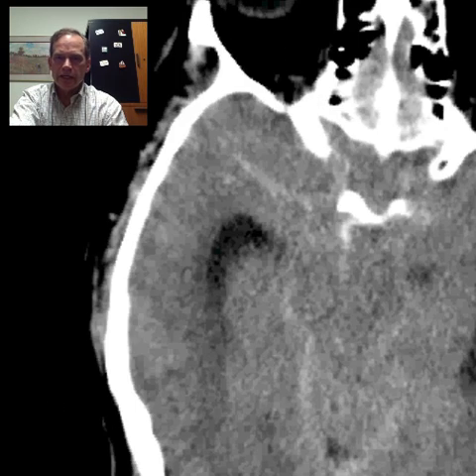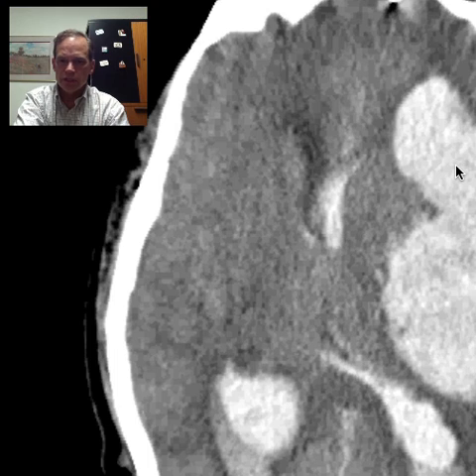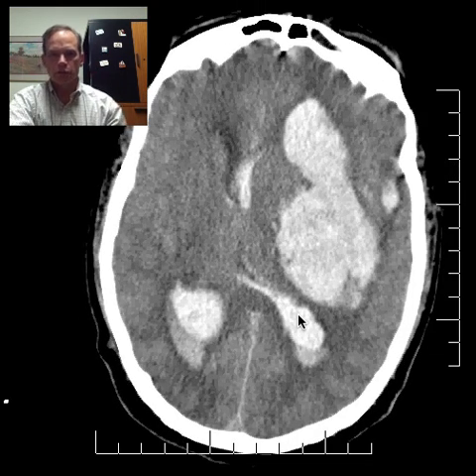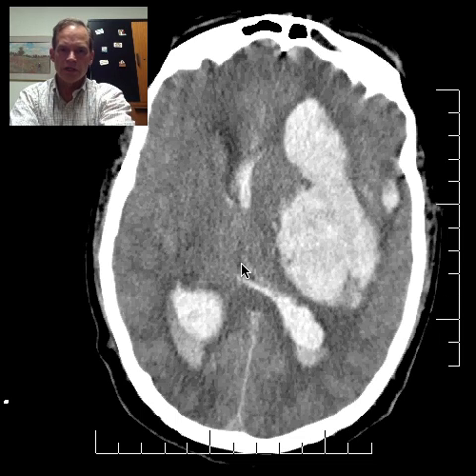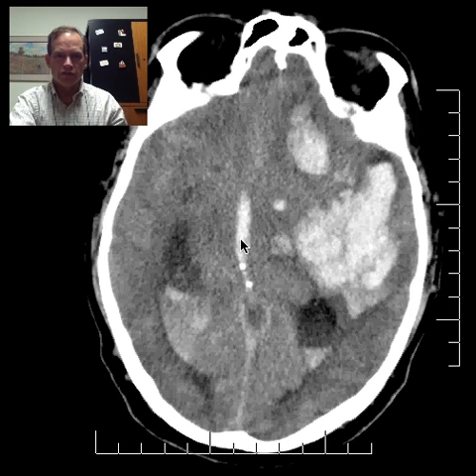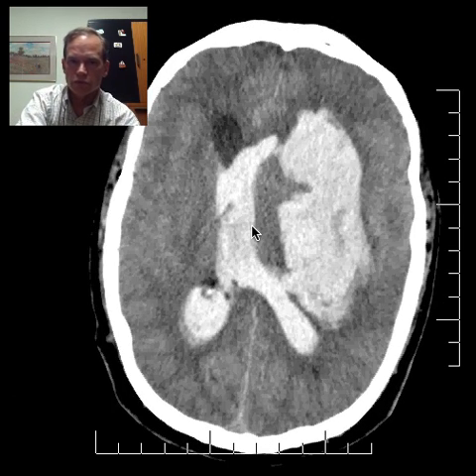So that's the big take-home point here, is that you have this gangbusters, huge hypertensive hemorrhage in the left cerebral hemisphere with lateral ventricular extension and severe midline shift. And the blood goes into the third ventricle, which itself is displaced to the right. And it takes a lot more pressure to displace that third ventricle, which is more inferiorly positioned and well anchored, than the hemisphere itself and the interhemispheric fissure, which is what we usually see midline here that's pushed over.